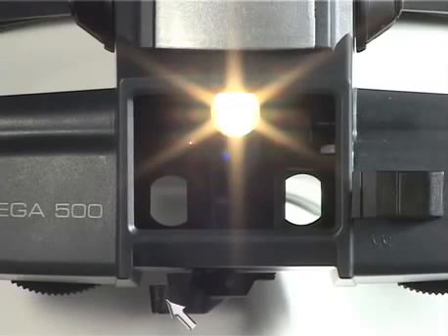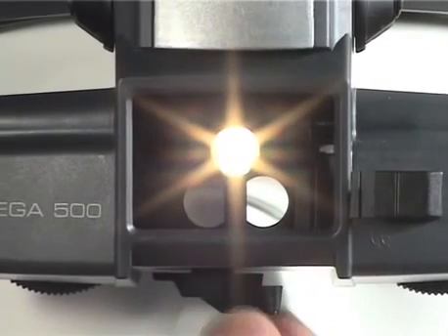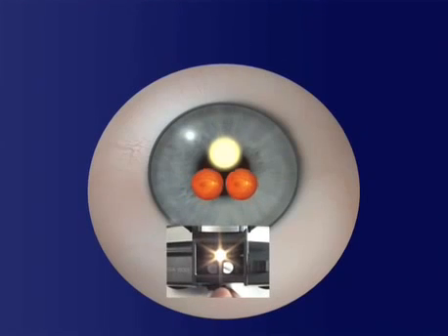A lever beneath the central window controls the separation of the illumination and viewing pathways. Moving it across converges the 3 elements. This allows the observer to retain a binocular view even with pupil diameters down to about 2 millimeters.